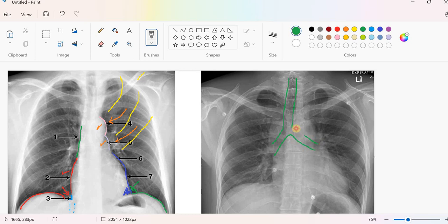In some chest X-rays, while you are commenting on the heart, the aortic knuckle is not bulging like that. It is a normal patient, but the knuckle is not obvious. So if it is not obvious, how can I find or track it? Usually it will be located above the left main bronchus. Since the trachea and bronchi are prominent here, I can tell with confidence where the aortic knuckle is in that patient.